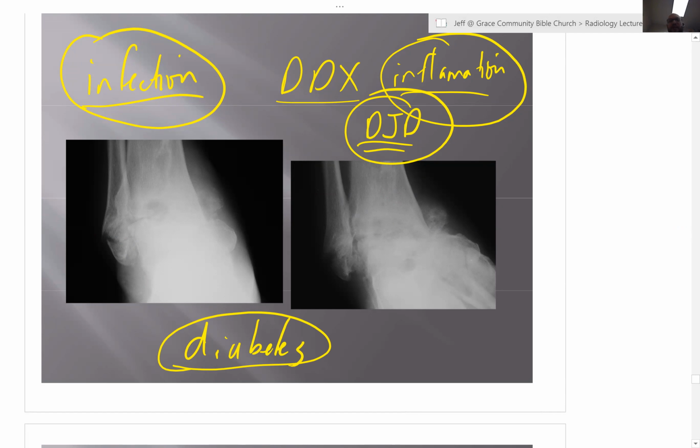So you've got a diabetic foot here with the 6 Ds of Charcot's arthropathy: dislocation, debris, distension, disorganization, density. It's just nasty looking. And when I see something that looks this bad, I really think of infection and diabetic neuropathy as my first 2 choices.